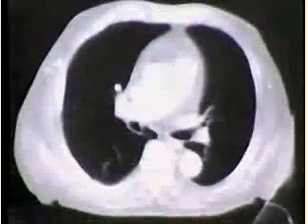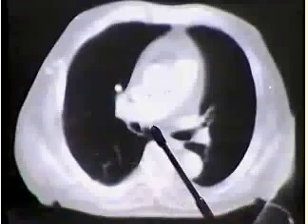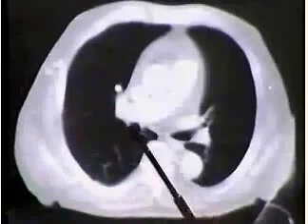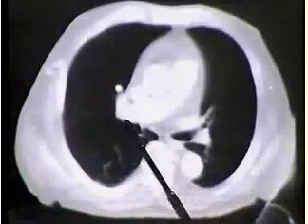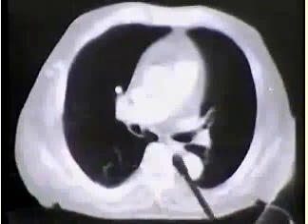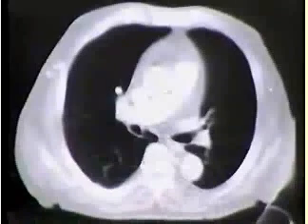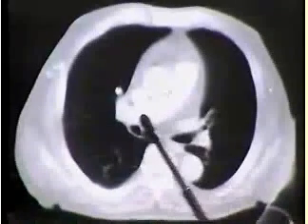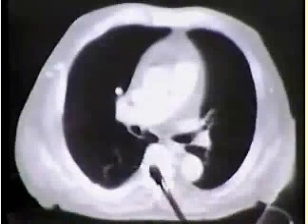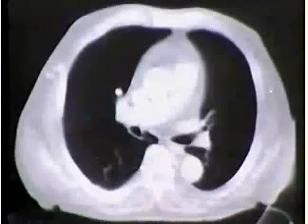If we proceed caudally a little bit further, again we have the air in the azygoesophageal recess. The two bronchi are separated even further. This is now the bronchus intermedius itself with its thin posterior wall. You notice this is almost all fat density filling in here, no soft tissue density. And you see in front of it the right pulmonary artery. The right pulmonary artery crosses the mediastinum below the carina.